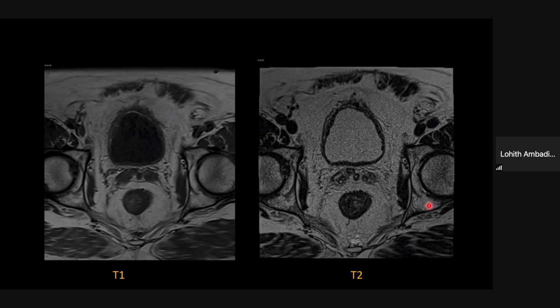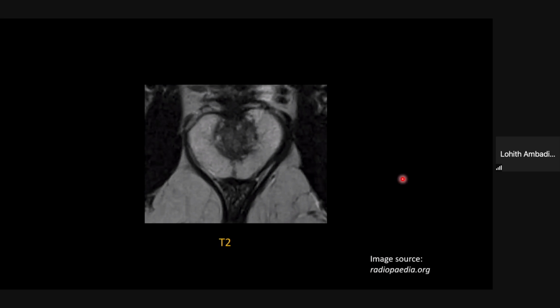We report them as hyperintense and hypointense in our reports. We also have isointense, which is in between, or we take neighboring structures as a reference to call something isointense. Now, bright and dark, hyperintense and hypointense, I will be using them interchangeably throughout the presentation.